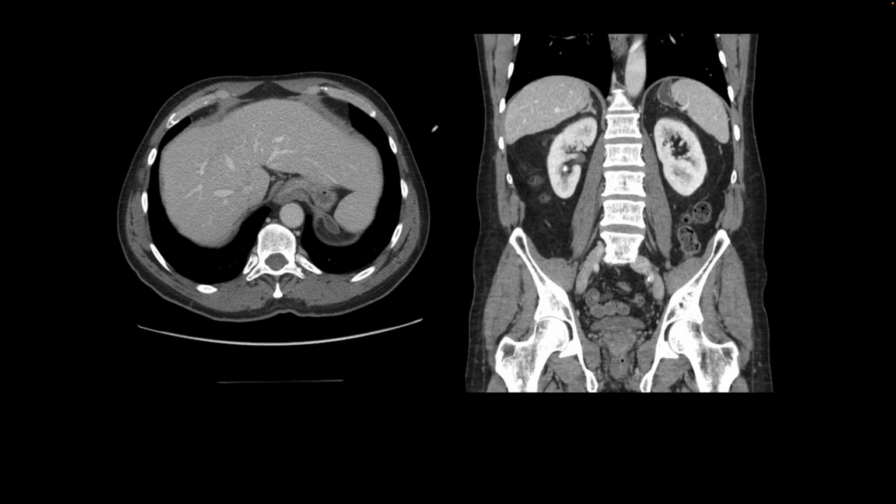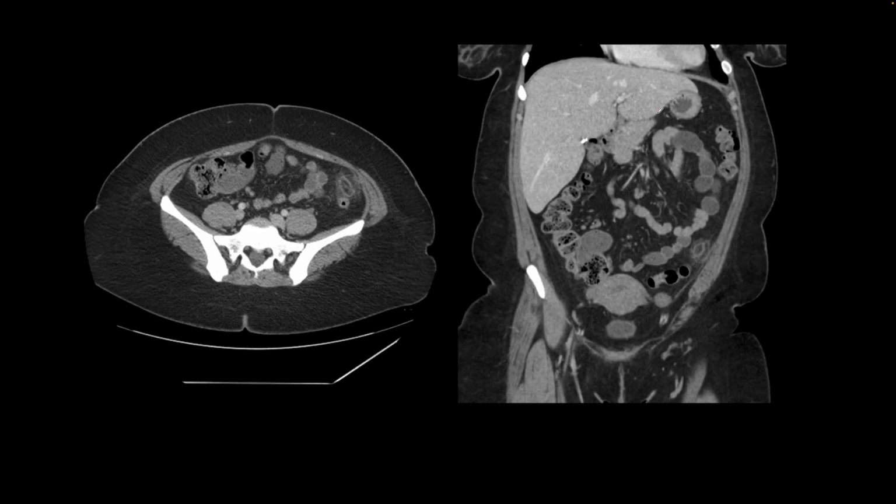This is our next patient, and the finding was in the left upper quadrant. Take a look at this focus. It's posterior to the spleen, and it's in the region of the adrenal. What could this be? It has a wall that shows enhancement, and if you are paying attention, there is a focus of air or gas right there. And so that focus is not some kind of a cyst arising from the adrenal or a lesion, but a gastric diverticulum.